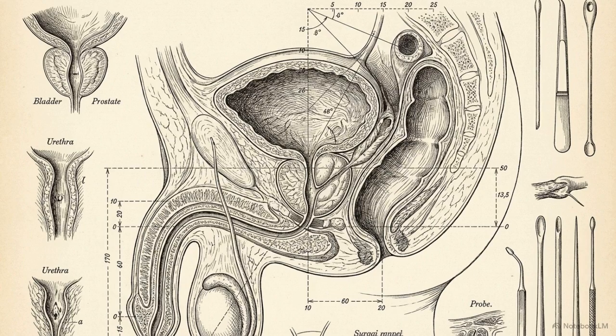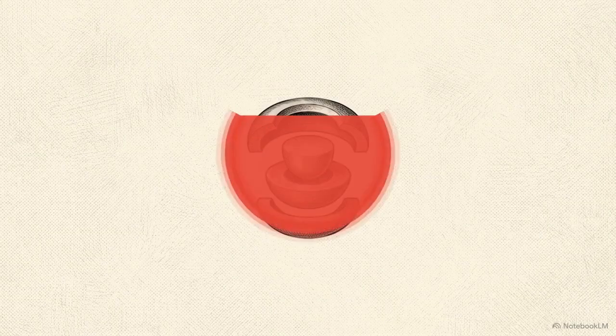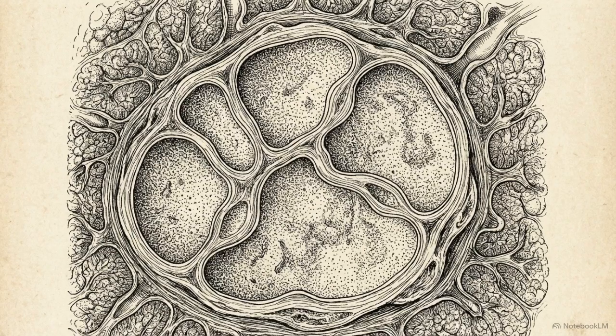The third and final clinical context we must evaluate is infection. Acute bacterial prostatitis frequently strikes the peripheral zone, presenting as a focal area of T2 hypointensity that structurally mimics an aggressive carcinoma. Because the visual overlap is high, differentiating a true prostatic abscess from a tumor requires a specific multiparametric signature. On imaging, an abscess presents as a multiloculated, thick-walled fluid collection.